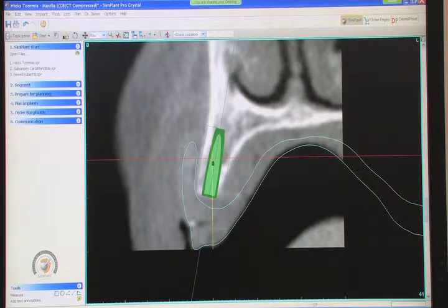As far as placement of this implant, any changes you'd like to see on that? No, that looks good too, right at the crest of the ridge. A nice long 13 millimeter implant is ideal. The other thing that I think of is maybe bring this up a little bit this way. Okay. Now the gray is 1.5 millimeters, so you do have a good 1.5 millimeters of bone on the buccal, a little thinner on the palatal. Are you okay with this position? Yeah, I'm fine with that.